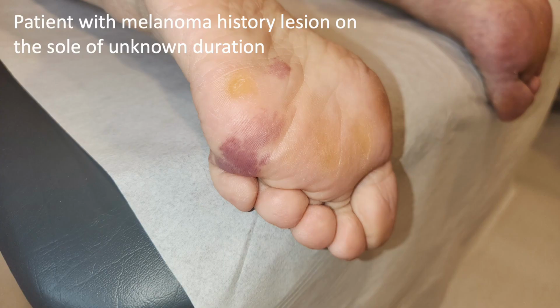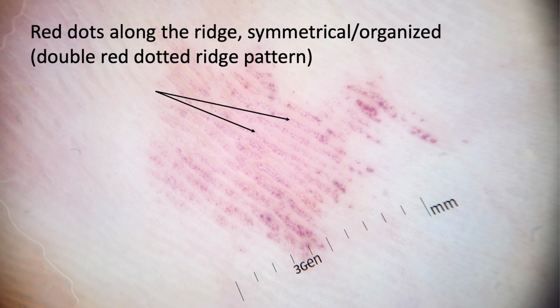We're going to switch gears now on the final part of this presentation to review how angiomas look on special locations. And when we say special locations, we're going to discuss the acral surface. This patient with history of melanoma had this lesion on the sole of unknown duration, and on dermoscopy, you see this. The presence of red dots along the ridges in this organized pattern.